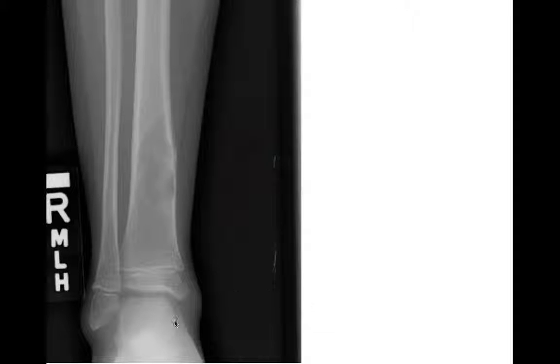Next case, radiograph of the distal tibia and fibula. We have a geographic lytic lesion, narrow zone of transition, sclerotic border, which is cortically based in the metadiaphysis of the distal tibia. Differential diagnosis in this case, primary consideration for this appearance, this location, and in this age of patient would be a non-ossifying fibroma. Non-ossifying fibromas are eccentrically located or cortically based, as in this case. They have a narrow zone of transition.